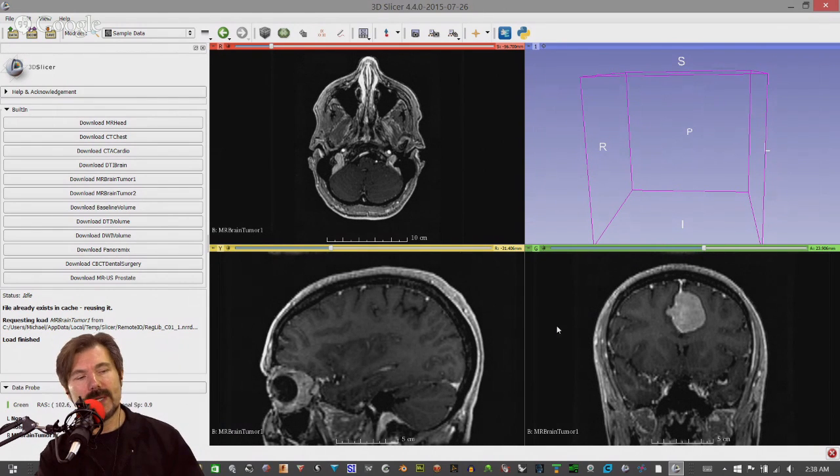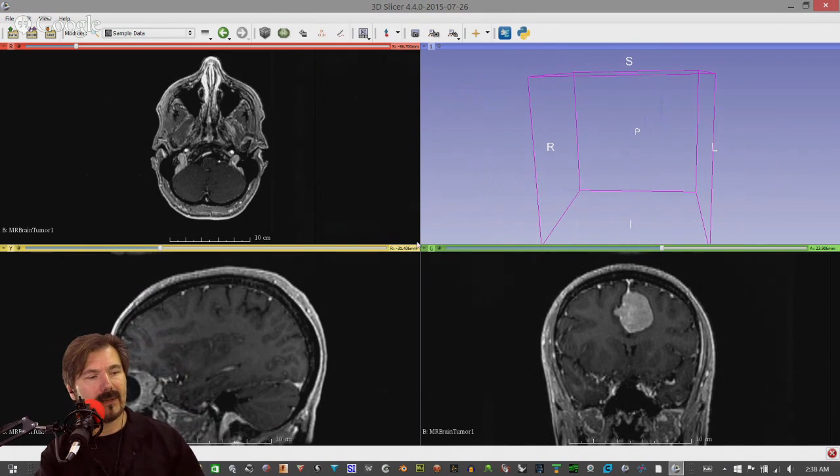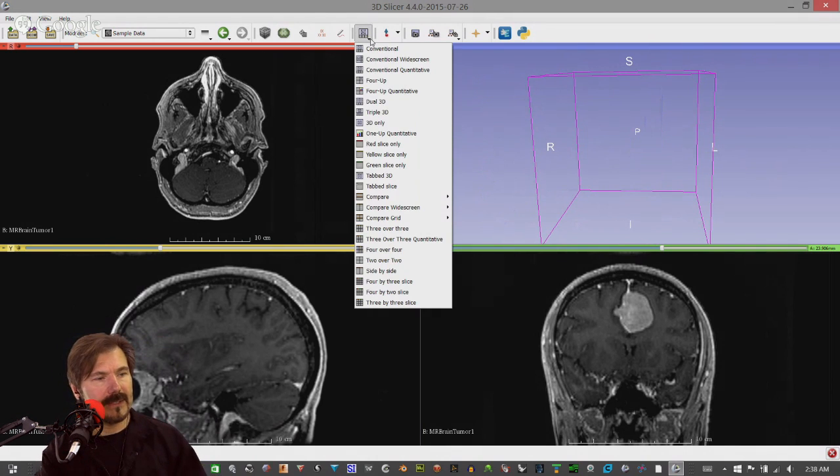Now that's good for viewing this, and later on we're going to see the actual tool that does it because it's very important for us to create tangible models. But for now, we're going to play around with the layout options, and I'm going to close this window for now so that we have a larger setup. But let's say you're not satisfied with this setup. Let me go into what else we can do.